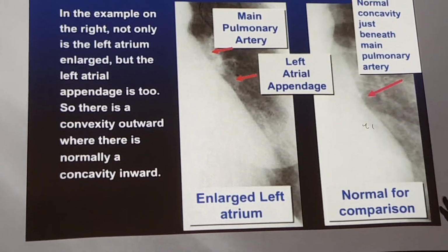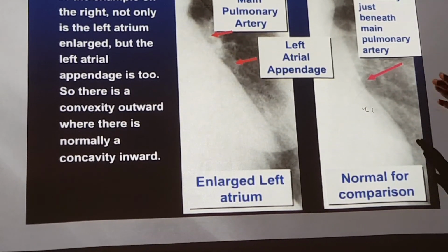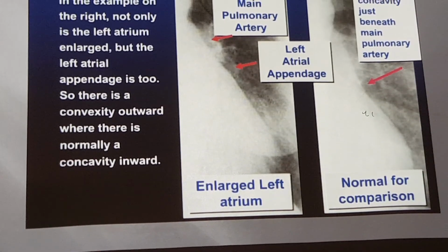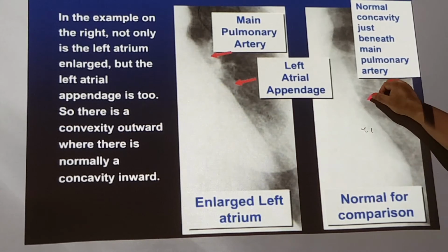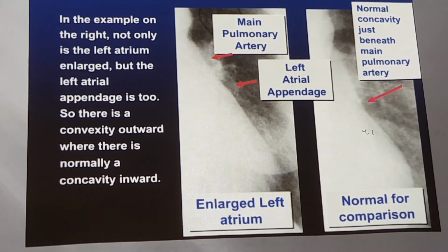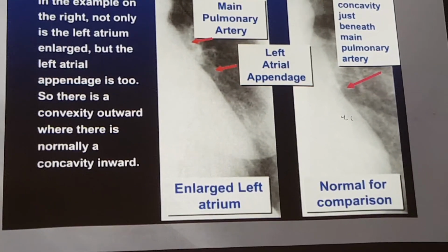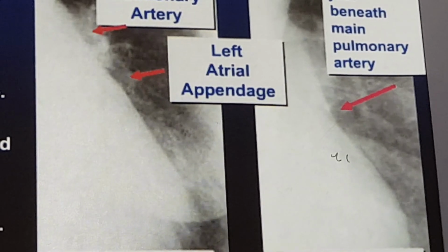Very slightly back. If you're not an astute radiologist, you will miss these things. So notice the straightening. Normally there's a mild concavity. So that's what we look for when we look at a chest radiograph. So even though it's a chest radiograph, we must study it very well.